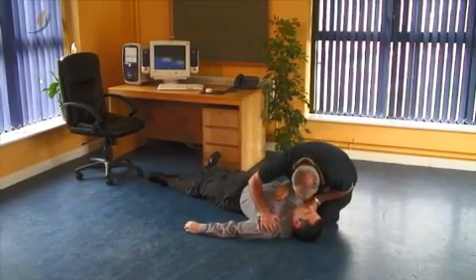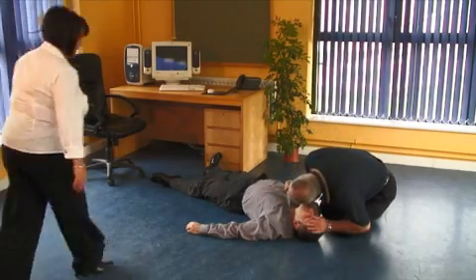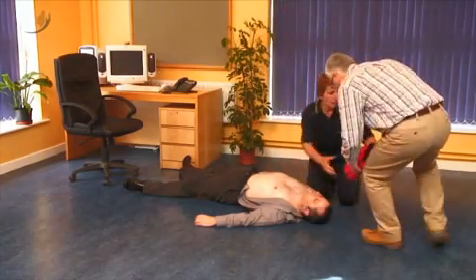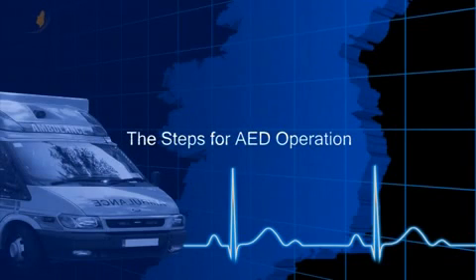You should use an AED only if the patient does not respond and is not breathing. Perform CPR until an AED is available. When the AED is available, stop CPR, turn on the AED, and follow the voice prompts. The steps for using an AED are as follows.